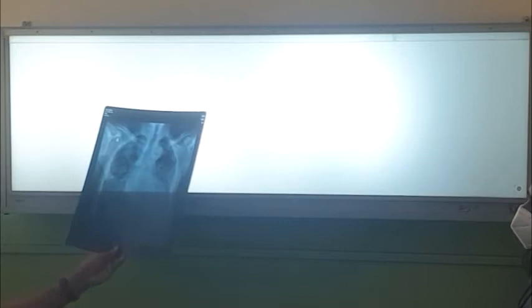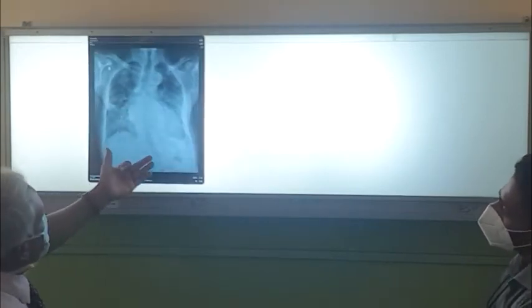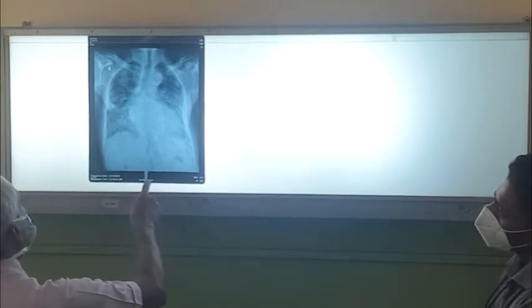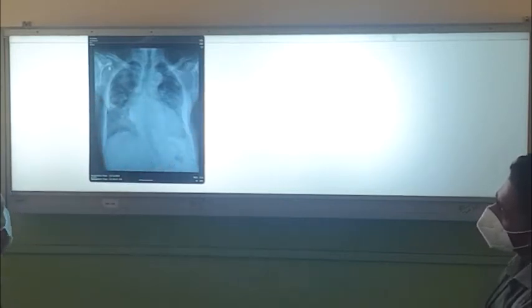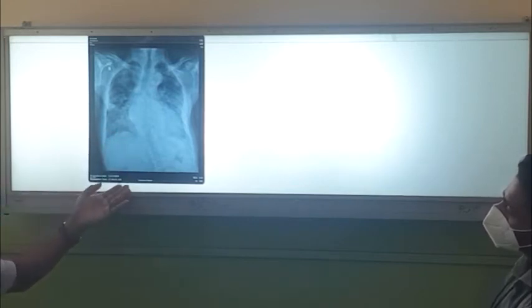And this is a poor quality X-ray, but one of our COPD patients who came with pulmonary edema. This is a big one, a bilateral pleural effusion, perihilar something there, right? Some people get upper lobe diversion. It's a poor quality X-ray. It's not a good example for pulmonary edema, right? The patient is fine.